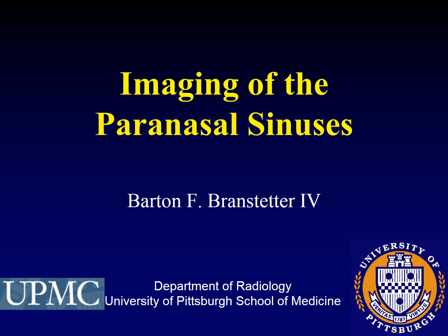This is part 2 of the lecture on imaging the paranasal sinuses. We've gone through modalities and anatomy. We're going to talk now more about the pterygopalatine fossa and some normal variants that we encounter.